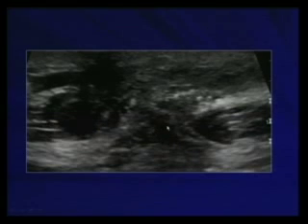This is a median nerve laceration, and you can see here the proximal stump, sorry, the distal stump, the proximal stump. You see the laceration, and you see this black mass here. This is called an amputation neuroma. This nerve is trying to repair itself, and since the fibers cannot reach the distal portion of the nerve, it forms this pseudotumor that is an amputation neuroma.